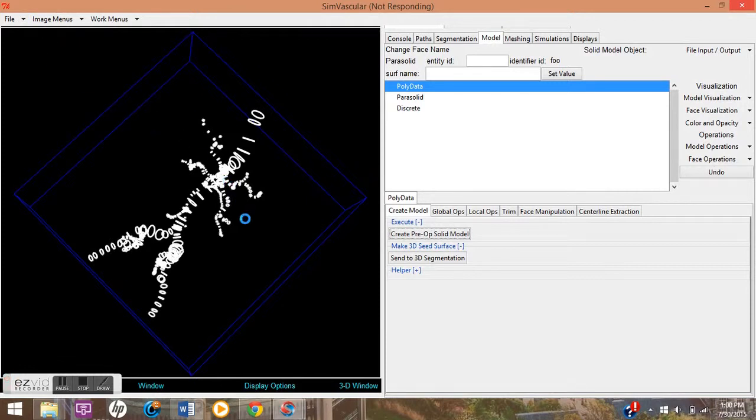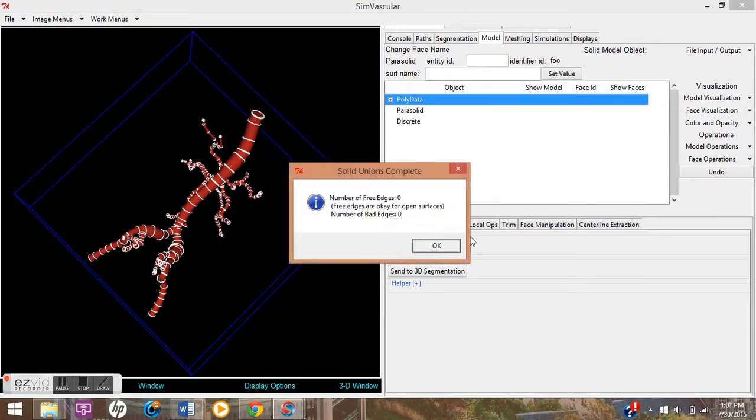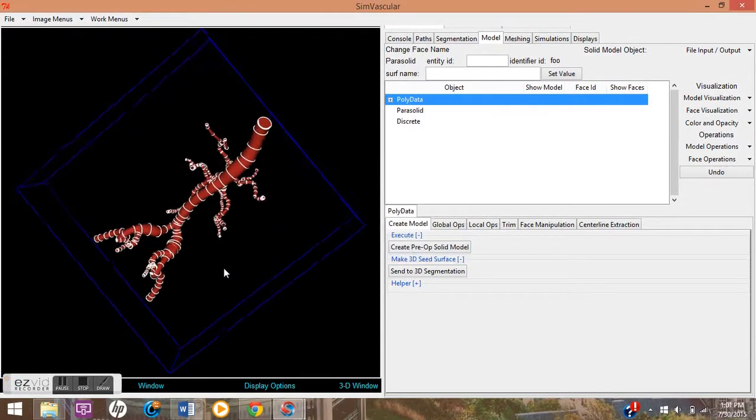And it's still going. This was my mistake here. I should have paused the video. But it shows that it's such a complex model, or a complex group, that it takes a while to actually create a model from it. And there it finally goes. So it's a good model. Came out well.